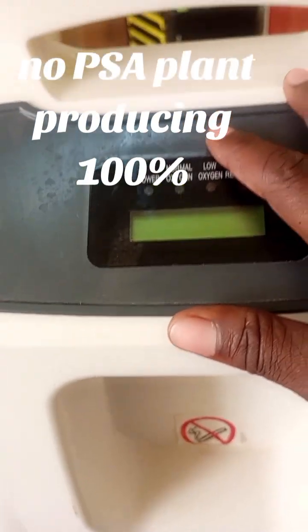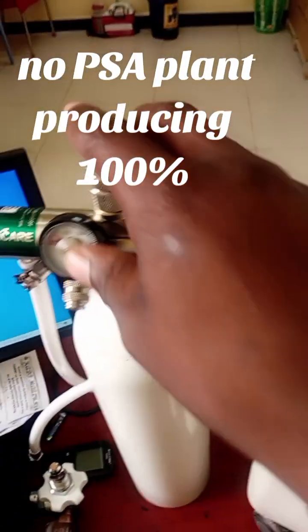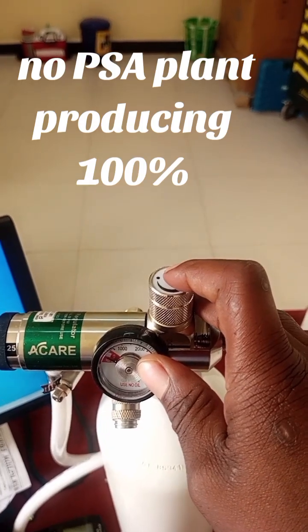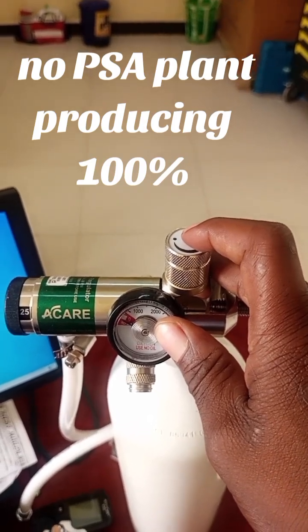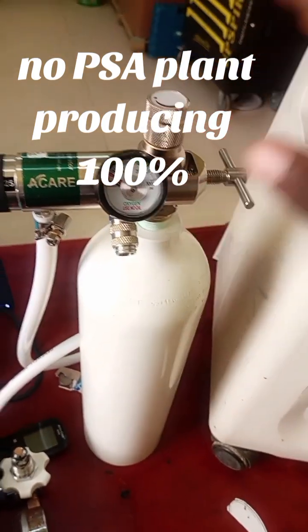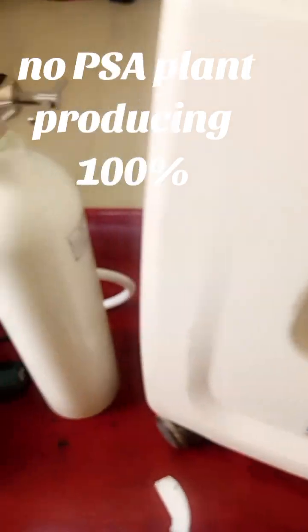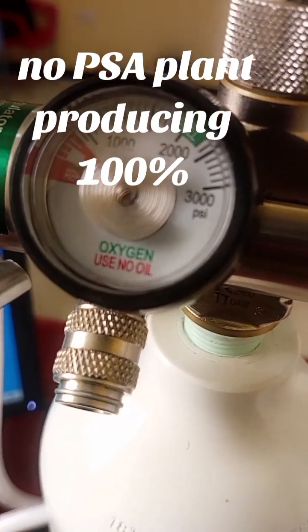This one in the hospital gives out much noise, but this one's working principle is quiet, making the environment more quiet, so there are no noises. That's why people also prefer to use this oxygen gas cylinder, because it creates a calm working environment compared to this one. So we need to understand this gauge.